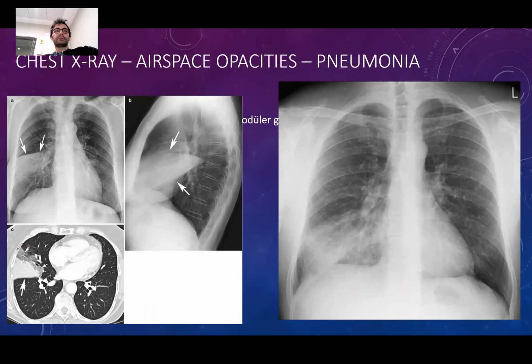Not clear? Look at this one, it's much clearer like this. It cannot go to the lower lobe because it's a middle lobe pneumonia. The middle lobe pneumonia is here. Inside the pneumonia it has some hazy appearances, but because it cannot cross the border, it will have sharp linings between the lobes. That's the reason why.